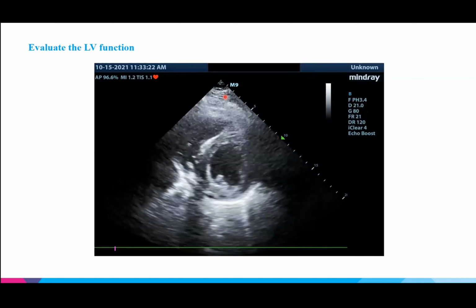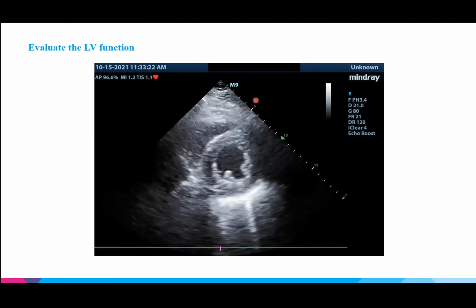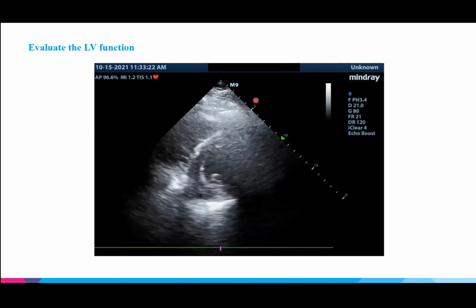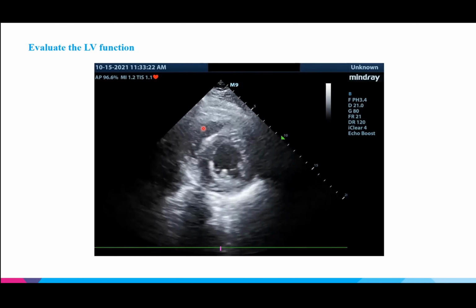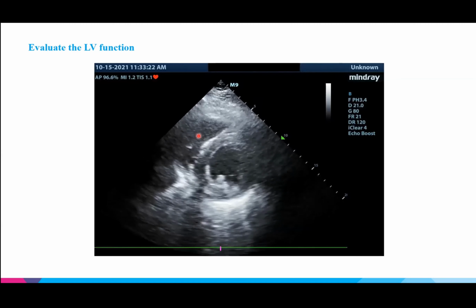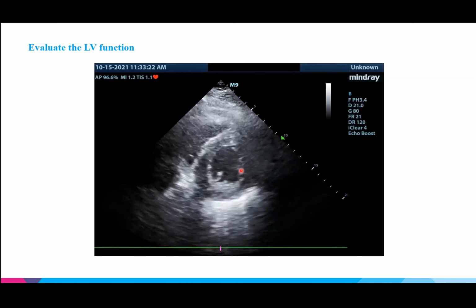All right, so we have about 55% saying reduced, and then some saying severely reduced, and then a few saying normal. So first off, again, what view is this? All right, excellent. Yeah, so parasternal short, and then just to make sure we get our anatomy, what is up here? RV, excellent. And then we're seeing something here, maybe a little bit on this side as well. What is this?